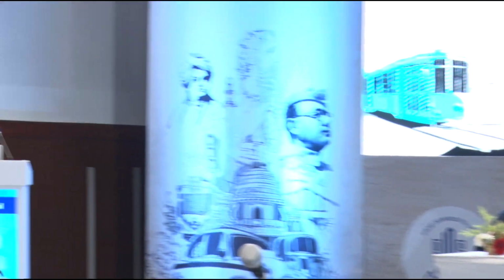Huge difference, sir, especially in a high volume retina practice. There's a human fatigue factor in every patient. I cannot do the same meticulous indirect in my first patient and the same meticulous indirect in my 60th patient. So sometimes you tend to miss things, especially in uncooperative patients. Sometimes the technician also says, sir, there is a hole visible in the supratemporal quadrant, and you see the patient again, and actually there is a hole which you missed because of a fatigue factor. So you have to be objective in documentation, and this helps a lot in that case.